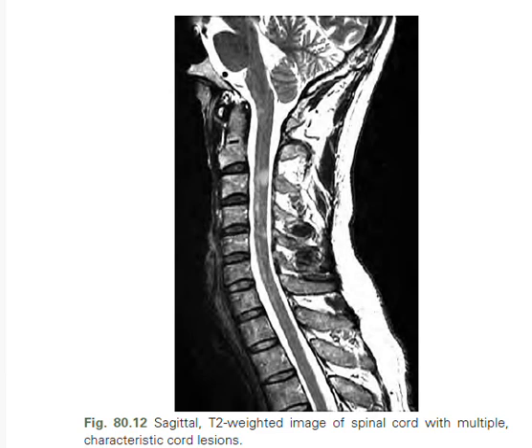This structural preference explains why patients so frequently present with symptoms like Lhermitte sign or posterior column signs, such as a loss of proprioception or vibration. If your axial cuts instead show symmetrical central gray matter involvement, that is a massive red flag that should prompt you to look for ischemic, metabolic, and alternative inflammatory etiologies.